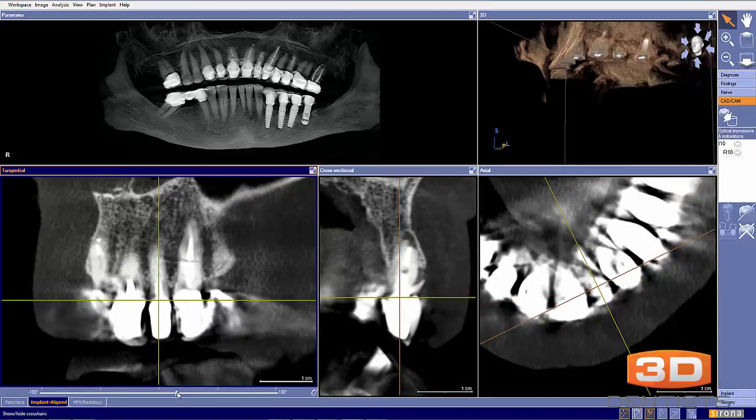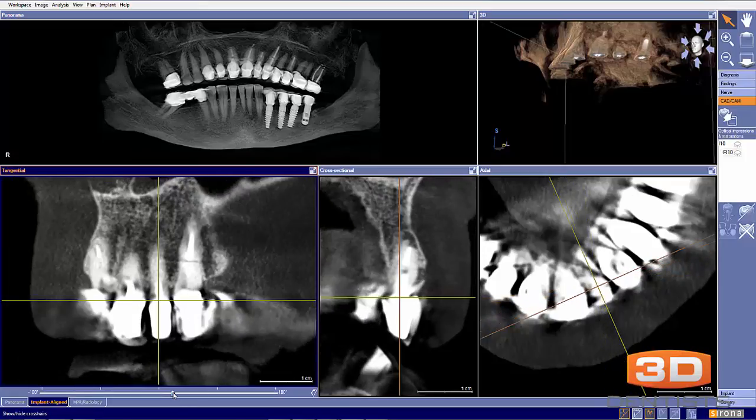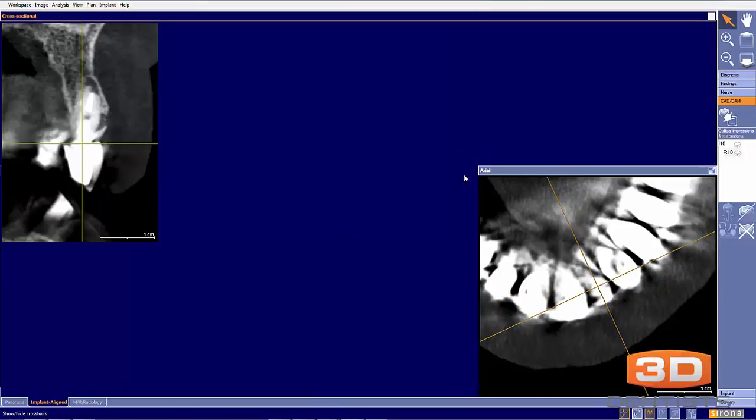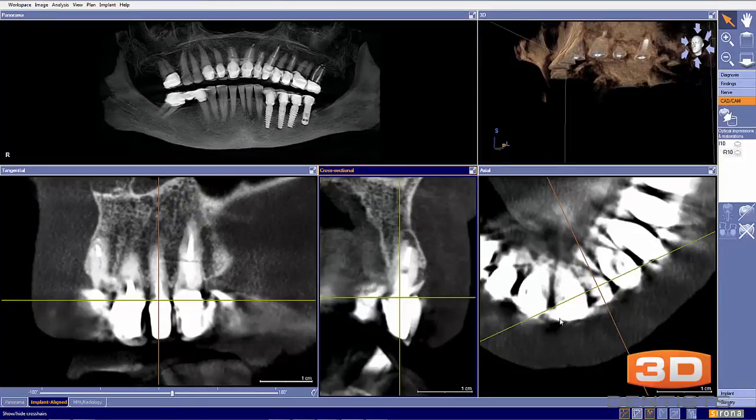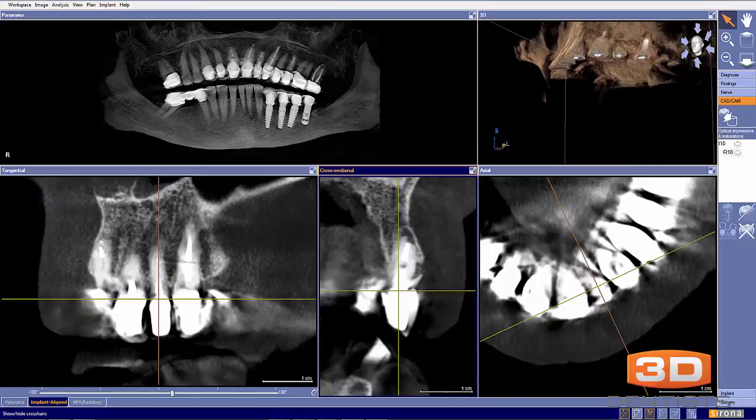Based on that, my initial assessment would probably be to consider immediate placement, just making sure to manage not dehiscing that buccal plate. And if we were to dehisce, be prepared to graft and to maybe place a collagen membrane internally or even externally if necessary. So that's there. And now let's go ahead and place the implant that you had designed, and there's our implant.